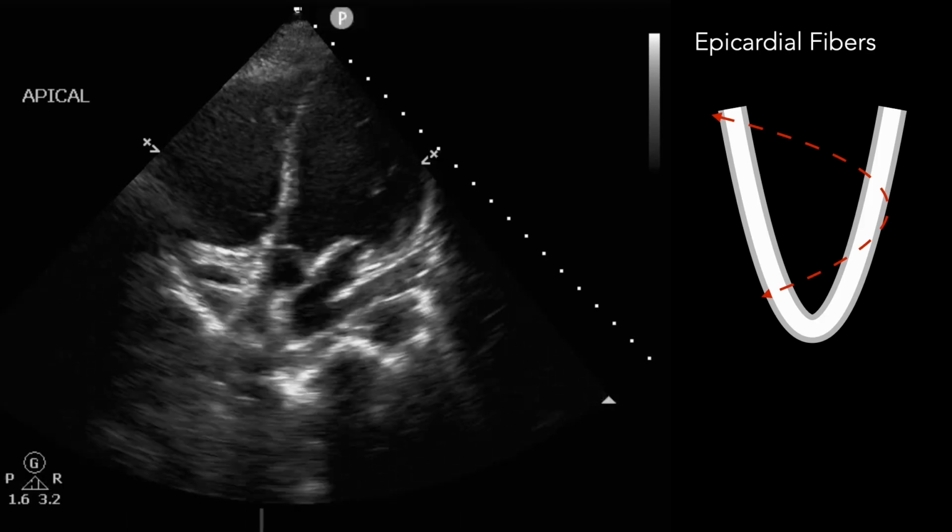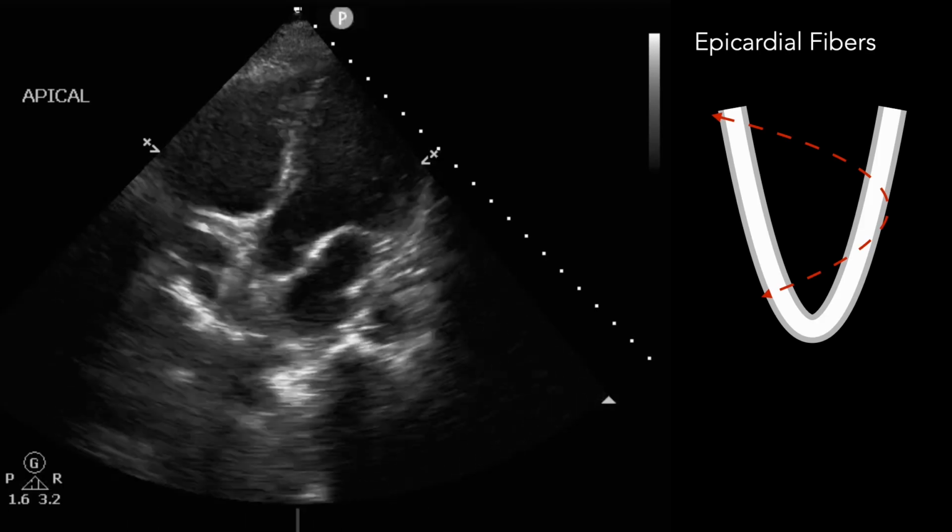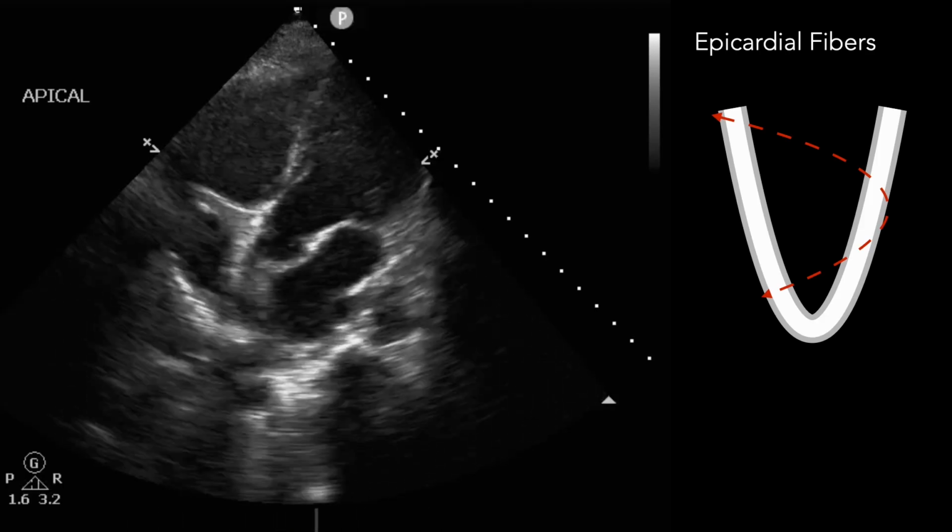But let's talk about this three-dimensional modeling so that we can have a little bit better understanding of how the fractional shortening works. And so next, what I'd like to do is just say, in ideal circumstances, right, in the echo lab, how do you assess for left ventricular volume? Right? And then what we'll do is do it in systole and diastole and then compare the two. And that gives us our ejection fraction, right? The proportion of blood that's squeezed out of the heart every time the heart beats.